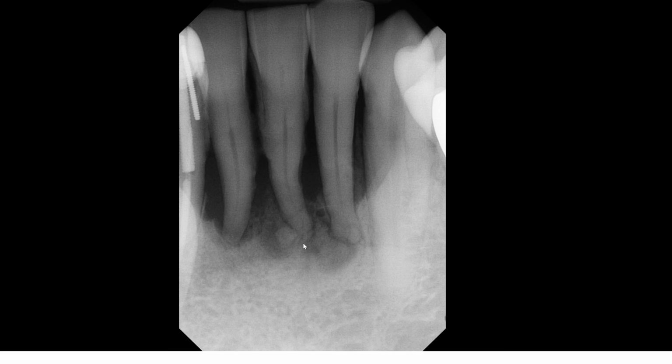Unlike on the panoramic radiograph, where we were able to see this but weren't so clear about this lesion. Also, the bone level wasn't very clear on the panoramic radiograph, but as we can see on this periapical, there's a severe, almost near complete loss of bone on number 25, and still very severe bone loss extending to the apical thirds of number 23 and 24.